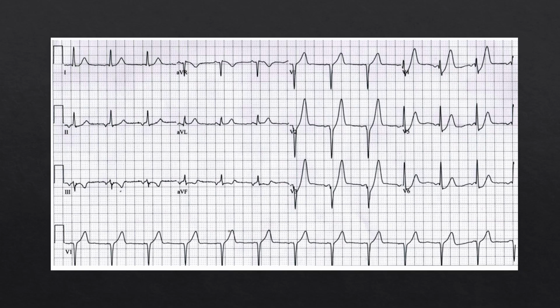Okay, so let's take a look at this ECG here. So if you scan across, let's assume your patient is a 50-year-old male presenting with ACS symptoms.